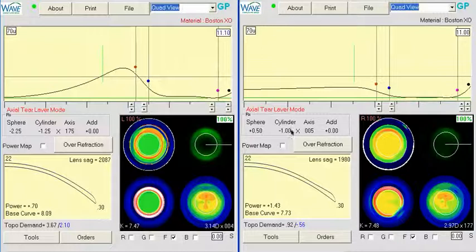a low prescription. More cylinder component than sphere, whether it's plus sphere or minus sphere, is generally very difficult to do. I have seen it done, but not with regular success. And for a newer wave practitioner, it might be just a big expense without much fruit in terms of visual results. But I will address the lens for the left eye.